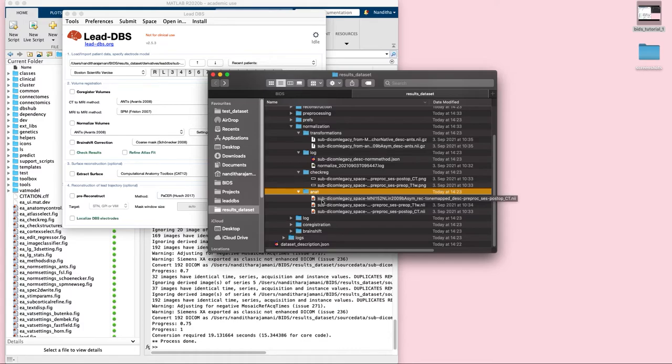So here it is the sub tag, space tag, and then rec tag, desc tag, and a ses tag. Each of these tags contains a value associated with it. So here the subject tag has a value of DICOM legacy, which is the name of the subject, and then the space tag is MNI152, which is the space of the particular file.